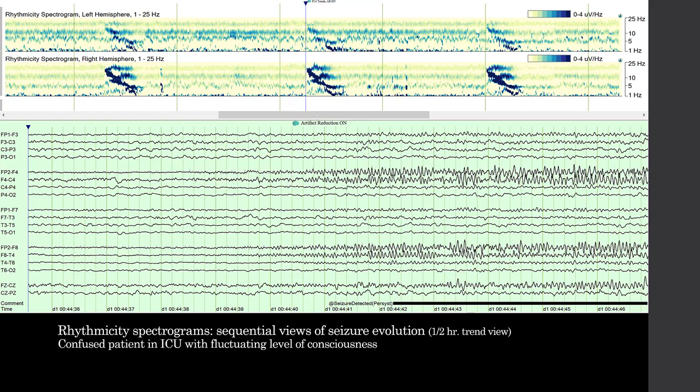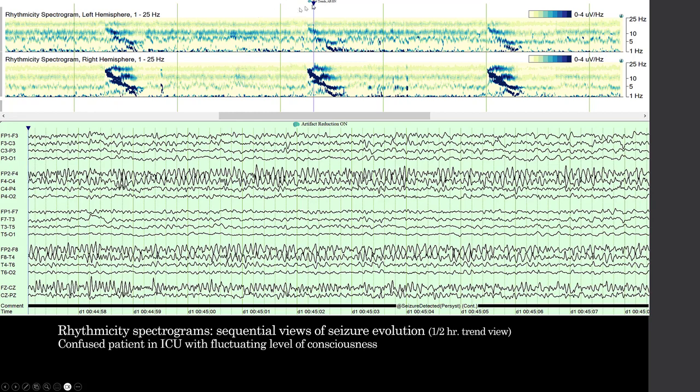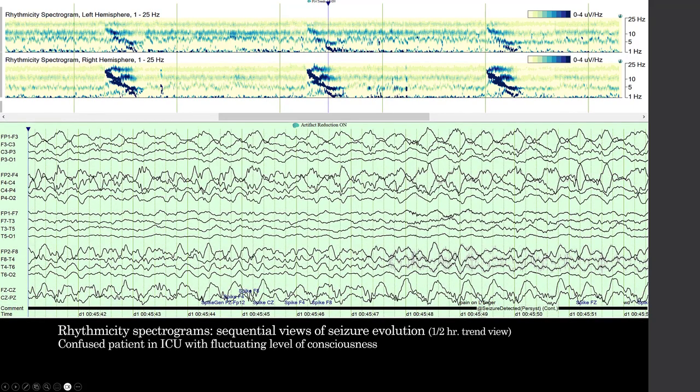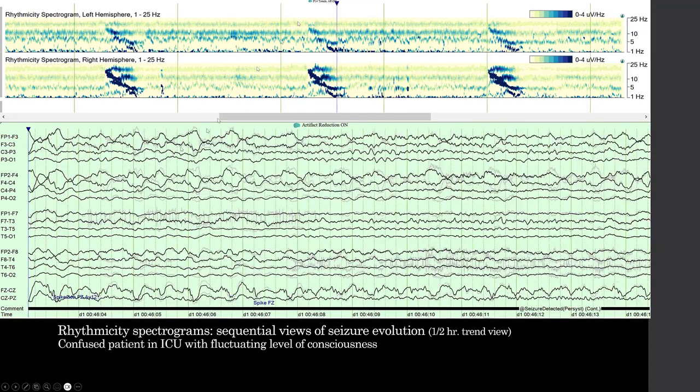If we jump to the next point, where the trend cursor is sitting at this point where this line has dropped a bit, the frequencies have slowed down. The periodic patterns have slowed down. Rhythmic patterns, here we go to the middle of this. It's getting slower still. And as we go successively through this, it's going from faster to slower, as we saw in the underlying waveforms.